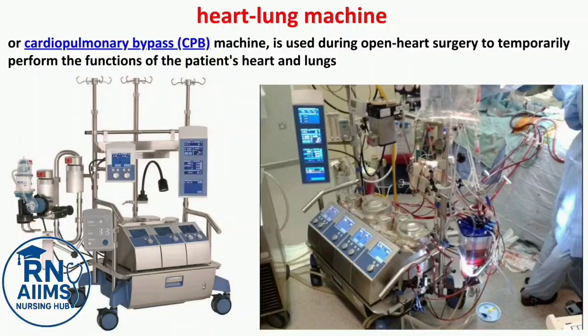Heart-lung machine or cardiopulmonary bypass (CPB) machine is used during open-heart surgery to temporarily perform the functions of the patient's heart and lungs.